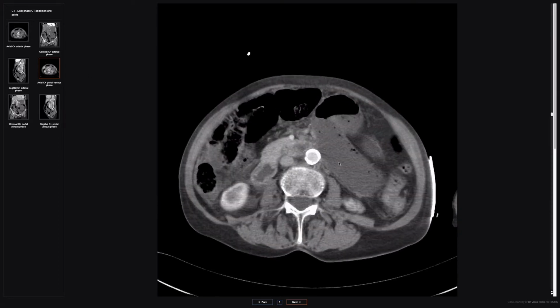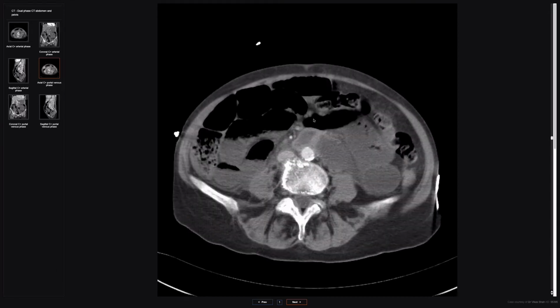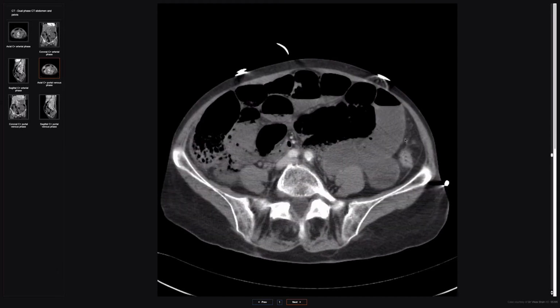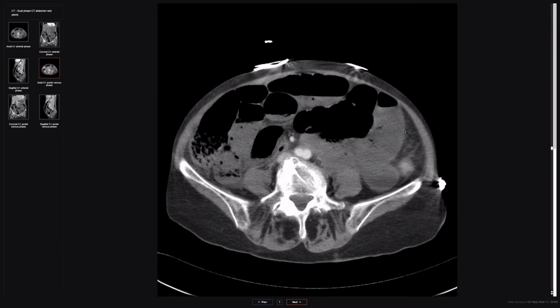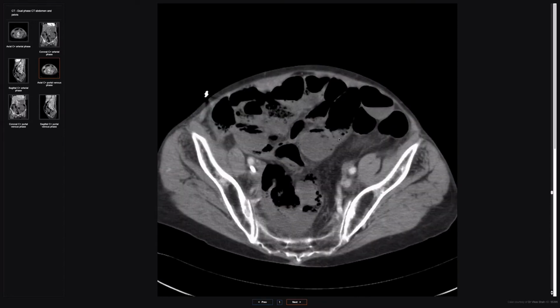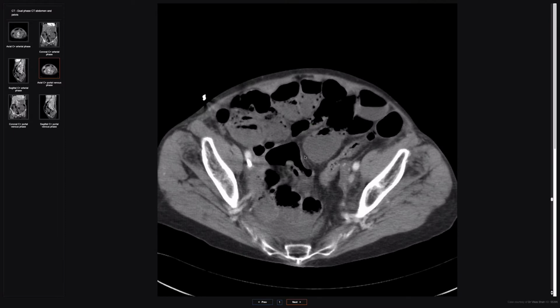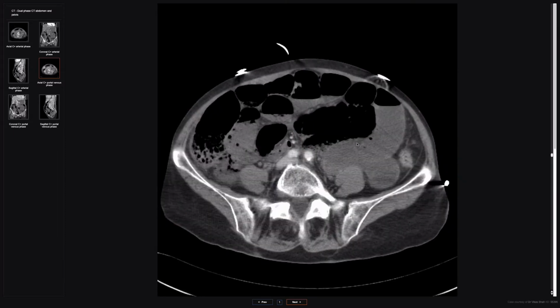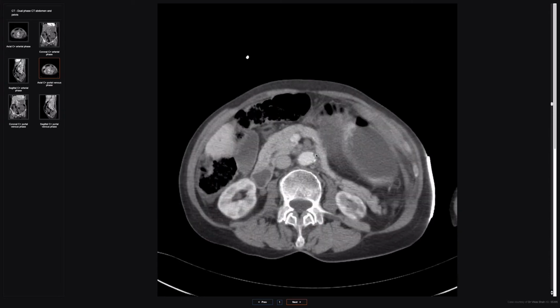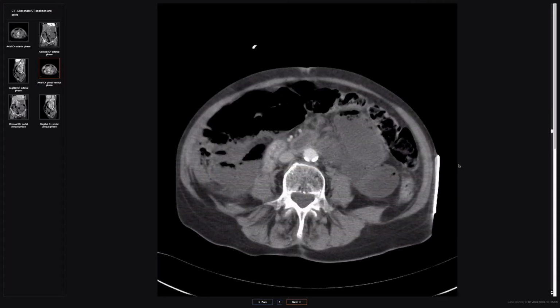And then there are other features here of arterial small bowel ischemia, which is distension of the small bowel. And this is a really typical finding where you get paper thin small bowel. So the bowel wall becomes extremely thinned. There is very little enhancement of the bowel wall, which you can appreciate on either the arterial or portal venous phase. And there's quite a long length of the small bowel which is distended. Because it's a fairly proximal obstruction to the vessel, you'd expect there to be quite a long length of small bowel involved.